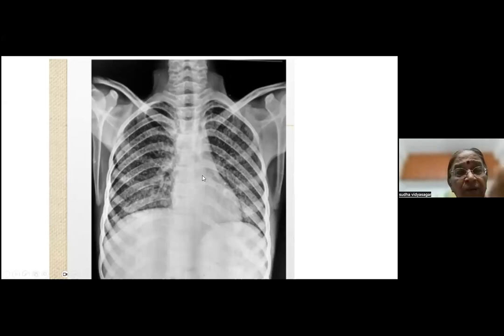Okay. So there's no mitral stenosis here, please. This is a miliary mottling, and whatever you read as differentials for miliary mottling should be thought of. And of course, the commonest is miliary tuberculosis. Let's stick on to that. Miliary tuberculosis is the commonest. You would do an eosinophil count. You would look for other conditions which have caused miliary mottling, like what you said. Some of them you have already mentioned. You should look for that. But this is very typical miliary mottling.